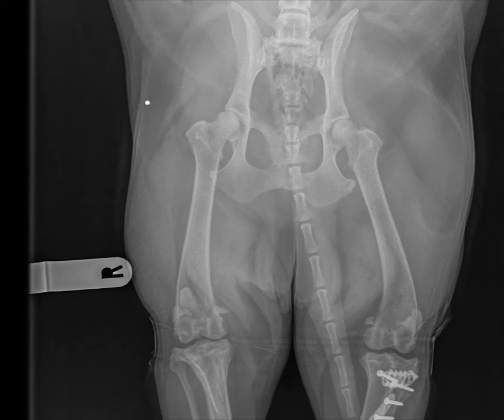Once I see asymmetry of soft tissues, another thing to be careful to pay attention to is the opacity. Here you can see that there's an area of reduced opacity in this part of the thigh musculature. This is consistent with the fat opacity, being a little bit more radiolucent than the muscle or soft tissue.